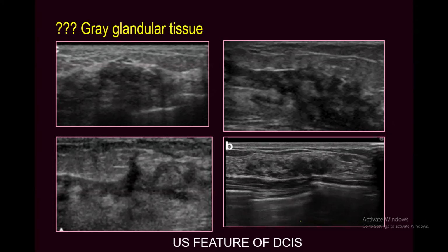Even invasive ductal carcinoma might present as a non-mass-like lesion. But most of the non-mass breast lesions are either invasive lobular cancer or ductal carcinoma. You got my point. Yes, because this is what we see in pathology.